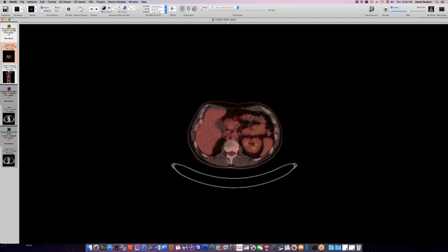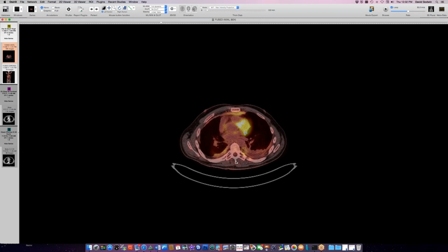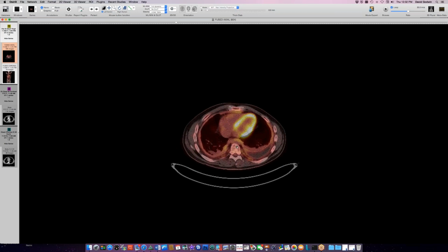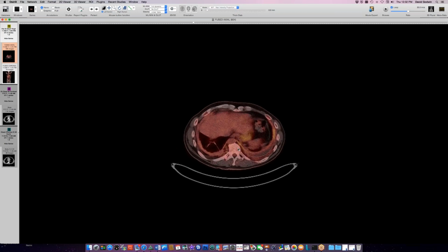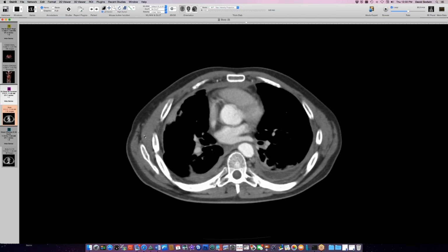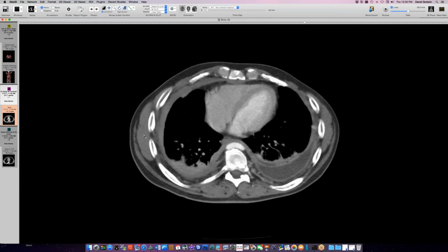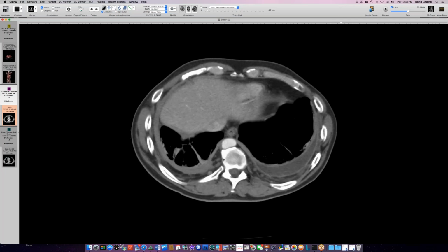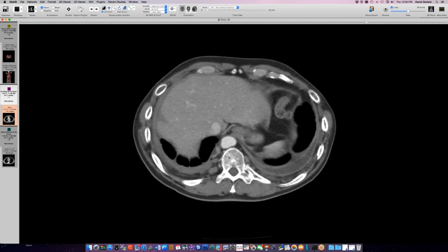It's really, you know, you see this with this and other processes that really thicken, and if you go farther down, to that contrast enhanced, it basically takes the aorta and turns it into an ovoid structure, and the aorta is a pretty high pressure, strong structure. If you go back to that contrast enhanced, it basically looks like it's squishing it like it's the SVC. And I've seen a lot of these, like Erdheim-Chester, do that to the aorta, which is quite uncommon. That's impressive. Yeah, it takes a lot. Yeah, he's got restriction of his aorta, not just of his lungs. So that's a very good point. That shows you the mechanical effect.